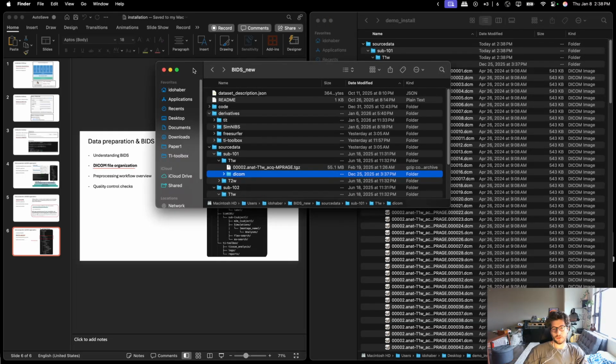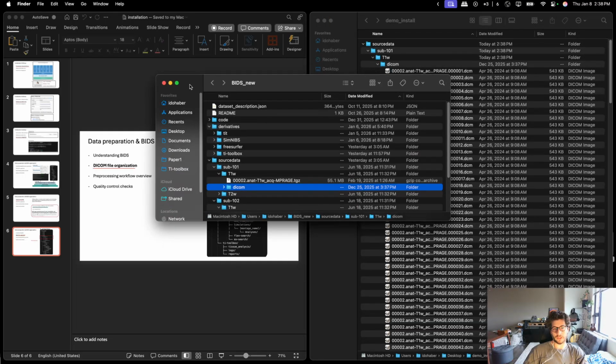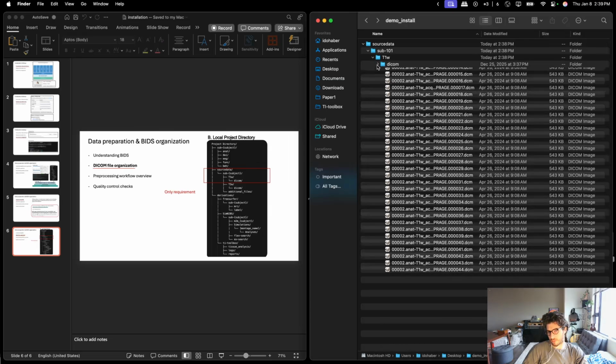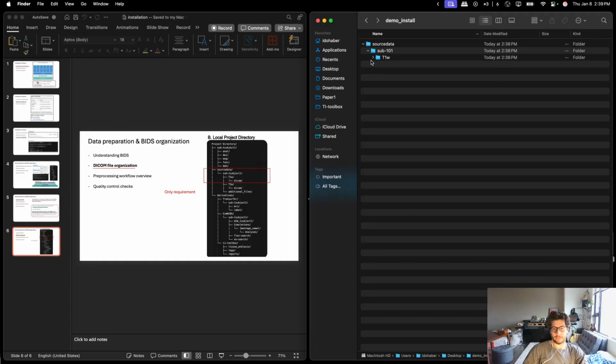to play with the TI-Toolbox. Now, you can also use standardized inputs like Ernie or MIDA or MNI or whatever you have available, and the desktop application ships with the MNI and Ernie for convenience. The CLI does not.